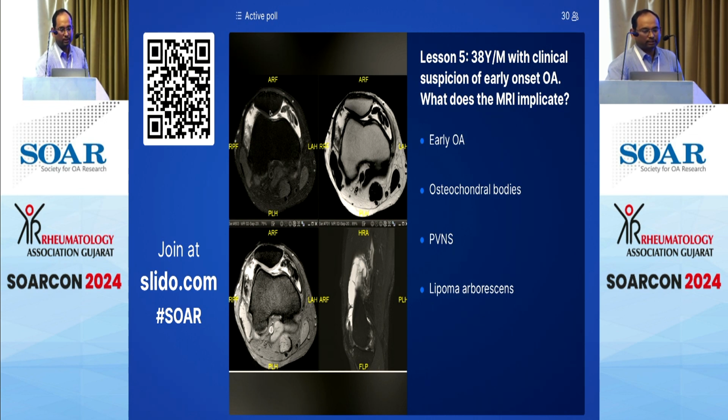So yes, we are definitely seeing joint fluid which is much more than what we expect. There is some cartilage loss in the trochlea, which is also seen here, there is a defect. But we are not seeing any classical feature of osteoarthritis. There is no osteophyte, there is no subchondral bone destruction, but there is something happening within the joint fluid.